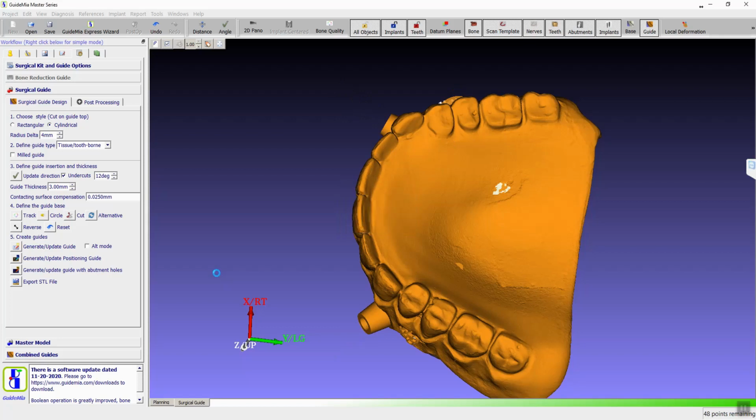Okay. Because the file that I really want is the one, because I know with 3Shape they have the file with the gingiva and the implant placement, as well as another one with just the implant placement. There's two different ones. Yeah, I'll show you how we export that file.